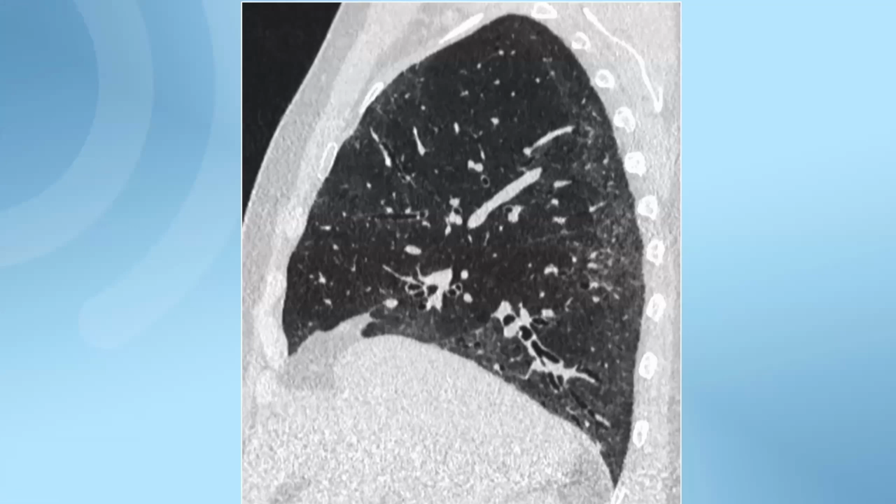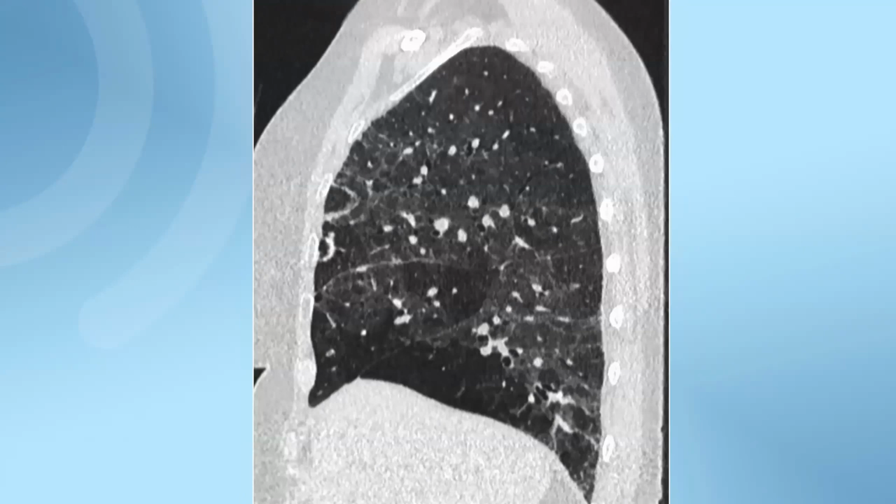Okay, let's move on to this case here. What do you see here? That's a completely different disease.